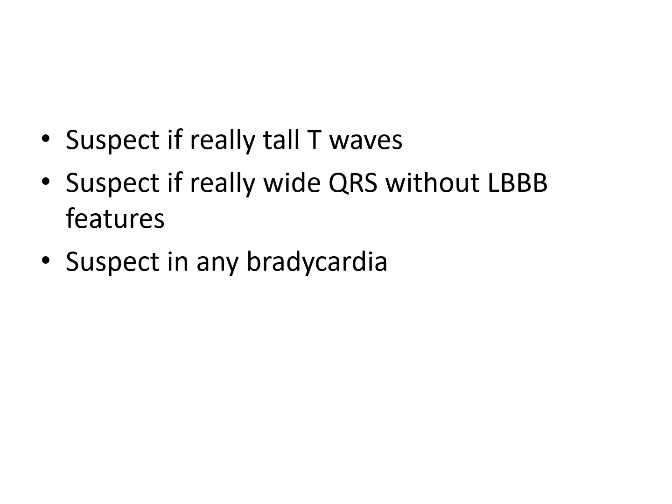So when are we going to suspect hyperkalemia? We're going to really suspect it in any bradycardia because it's part of DIE, drugs, infarct, electrolytes. But specifically, we're going to suspect it, obviously, if the clinical diagnosis is there. But if on the EKG we see a wide and slow QRS without left bundle branch block features, and if we see slow rate with tall T waves.